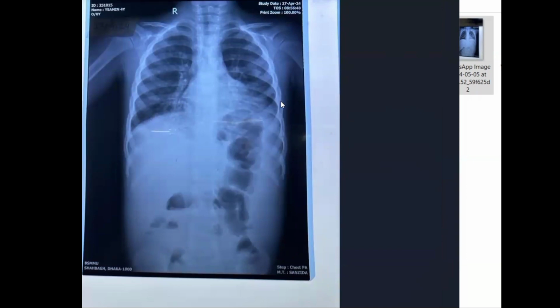So thus we can understand pathology from reading a simple chest X-ray. So thank you all. We will next time discuss inshallah more about chest X-ray, not only chest X-ray, X-ray of the paranasal sinus, adenoid, and others.